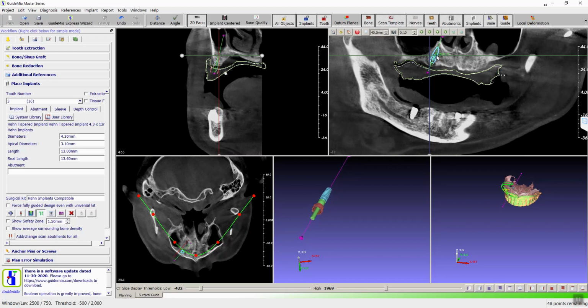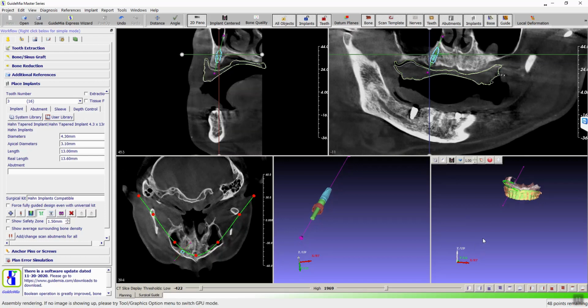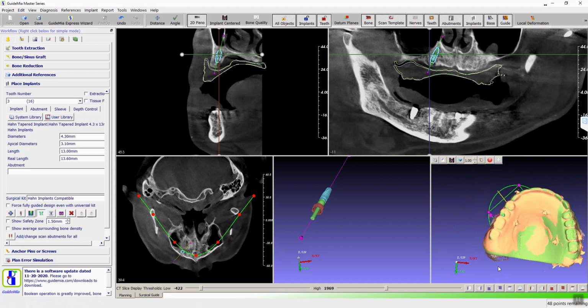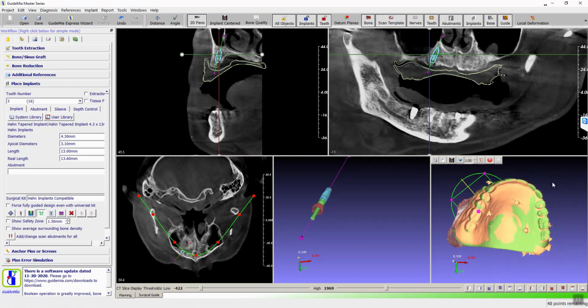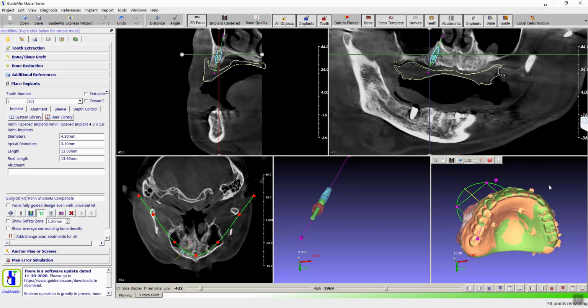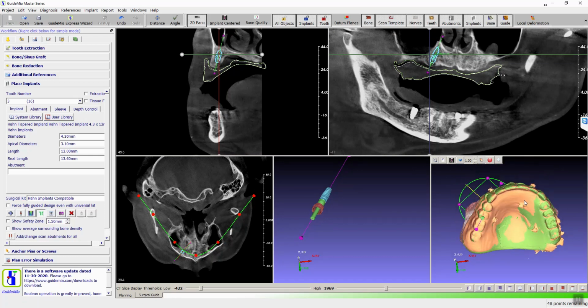It's going to be right up against the sinus. Yep. That's the one we want the multi-unit on. All right. So precision is good, right? Yeah, we'll throw a multi-unit on it. All right. So we have that. Then what's the next? 5? Yeah, I was just saying, that's fine, I think. All right. Size. Let's just do that for now. I'm not sure.